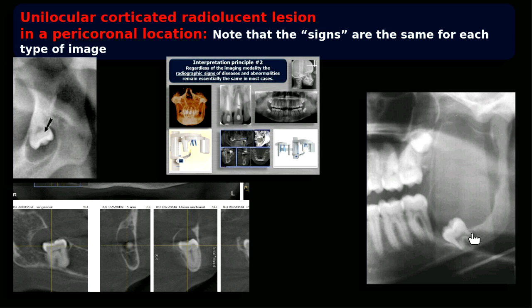And here also you can see CEJ to CEJ goes all the way up. So this turned out to be OKC in this case. So here we followed the radiographic signs using the abnormalities of this area.